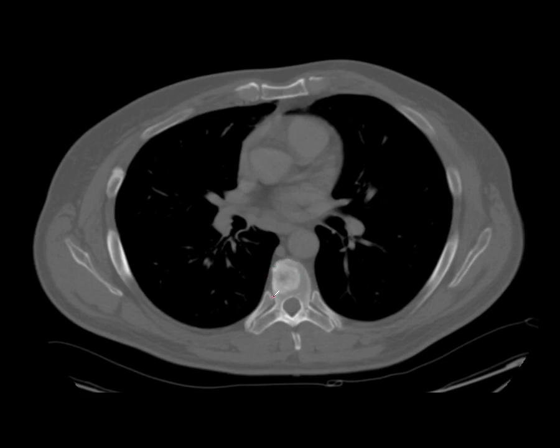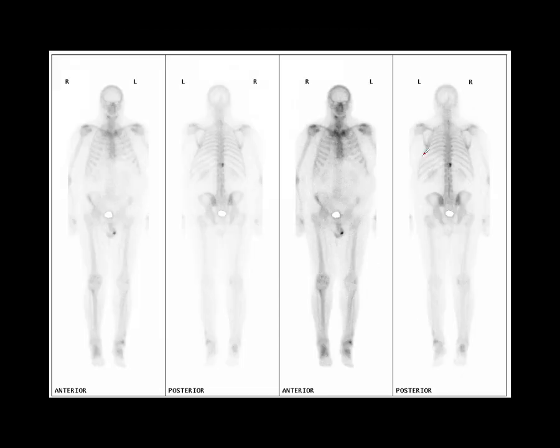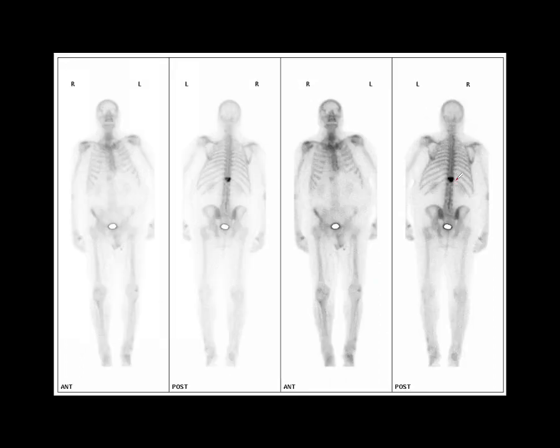And that's undergone healing. If we performed a bone scintigram now, this would show greatly increased activity, reflecting the underlying osteoblastic reparative process. So it's very important that whether we're looking at CT bone windows or bone scintigram, we don't attribute this change in activity from here to here as being disease progression, if it could be due to underlying osteoblastic treatment response. So that's something you've always got to consider when a patient is commenced on treatment and you're asked to look at follow-up examinations.